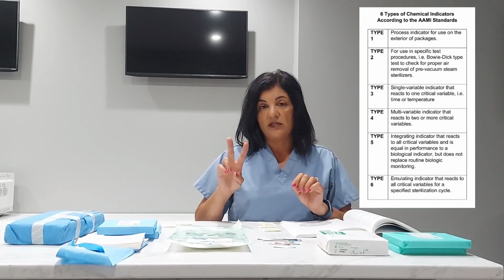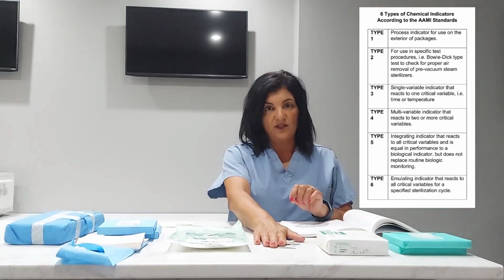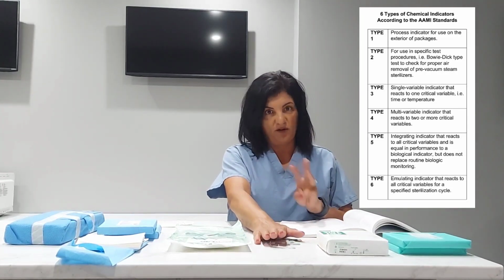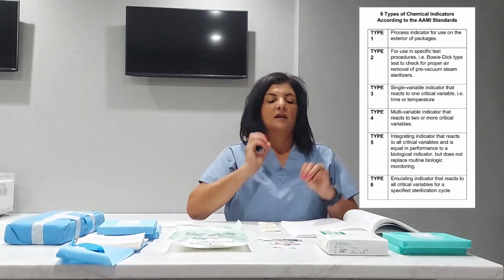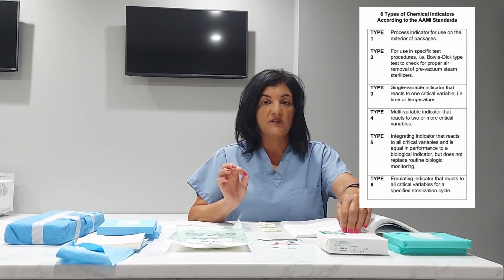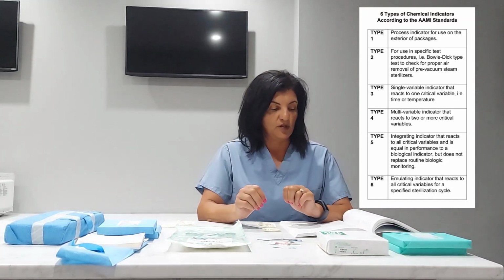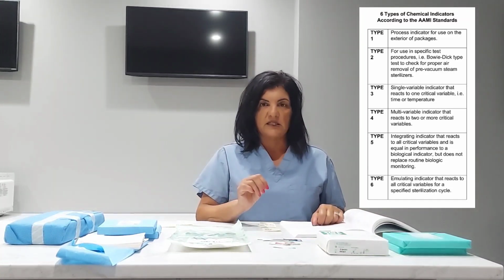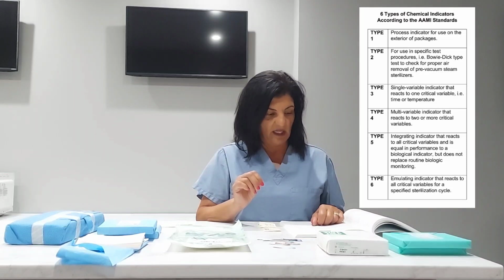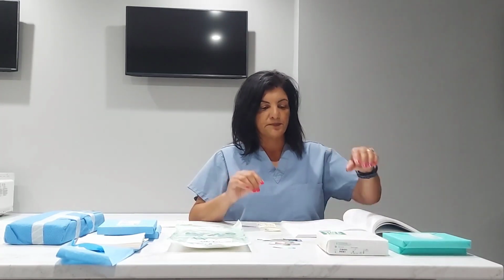Class 4 is reacting to 2 of the 3 process variables. Class 5 is reacting to all 3 variables. And then your class 6 is reacting to specific cycles. So I have completely confused you. Again, refer to your ST79 book, pages 78, 79, and 80. It goes into a little more detail.